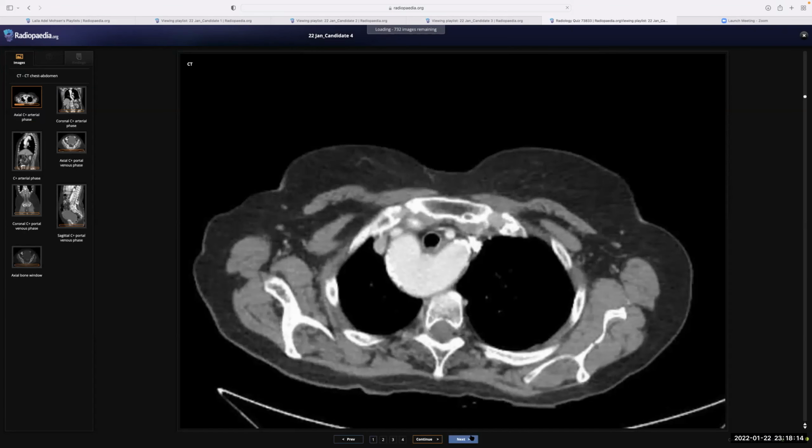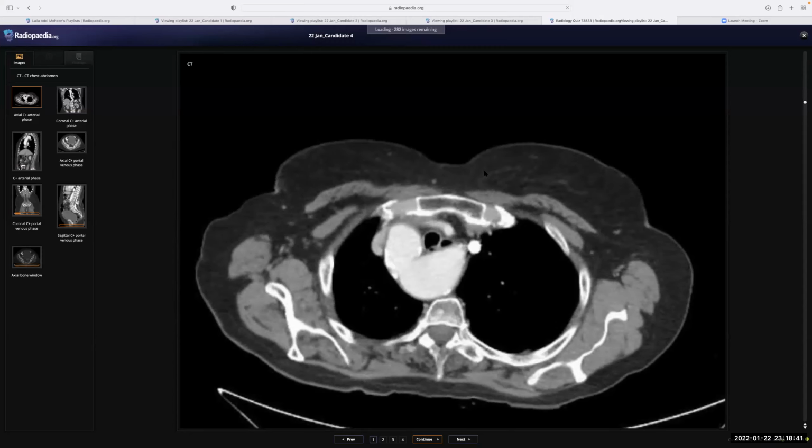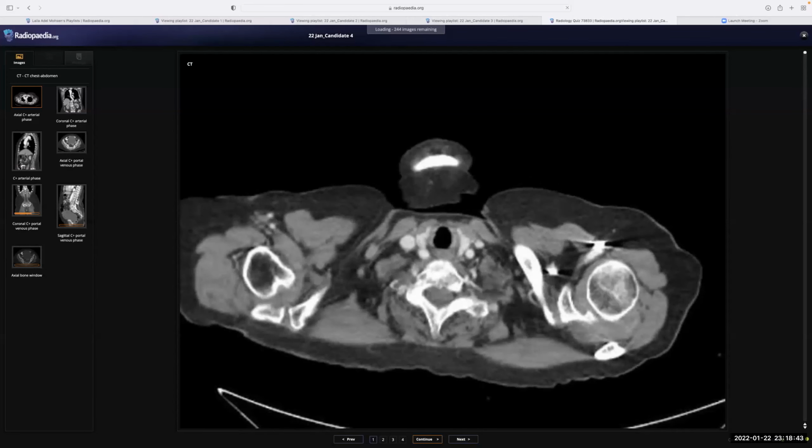So this patient has a CT done for evaluation of a mass. Unfortunately, we don't have the X-ray. Can you please repeat, for the evaluation of a mass? Okay. So this is a contrast enhanced CT scan, and this is a scrollable image. So I am scrolling craniocaudally.